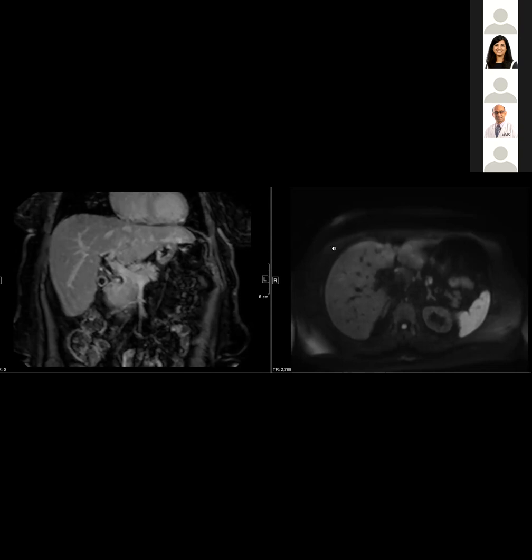I wouldn't have thought of adenomyomatosis here because I think of adenomyomatosis as having cystic spaces. But you feel that it can also look like this? My sense about this is that luminal narrowing of the gallbladder is worrisome, obviously, for cancer. You have to be concerned about a mucosal process. On the other hand, most cases of adenomyomatosis do have cystic spaces. This doesn't really quite look like that.